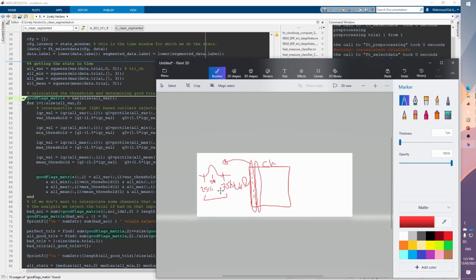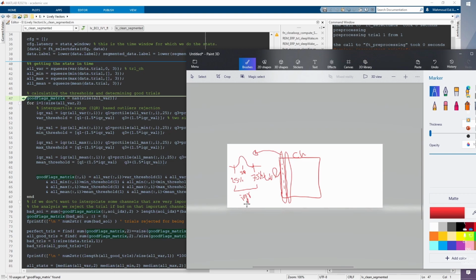I'm going to get this and define it as IQR, and then a value that is an outlier is defined as anything that goes below the first quartile minus 1.5 multiplied by this interquartile range. People normally play with this value, so you can see that this could be 3, this could be 2 and other things, but I think in a lot of places you'll find this 1.5.